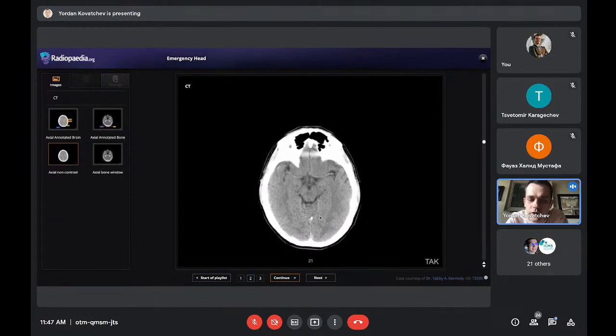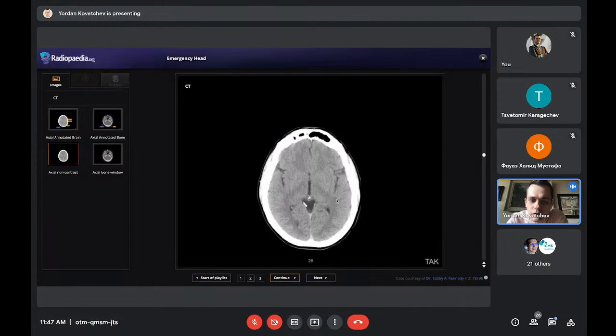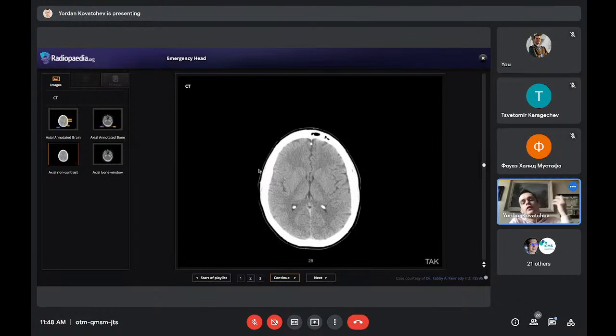We go above the tentorium. Now we are in the supratentorial space. We have the frontal lobes here. And again, I'm going to the basal ganglia. Remember this image, even if you don't actually remember which is which. This image has to be etched in your brain, because when you open a head CT, 90% of the cases in emergency setting, you're doing a night shift, this is where the pathology will be. You see something here. It's really, really often.